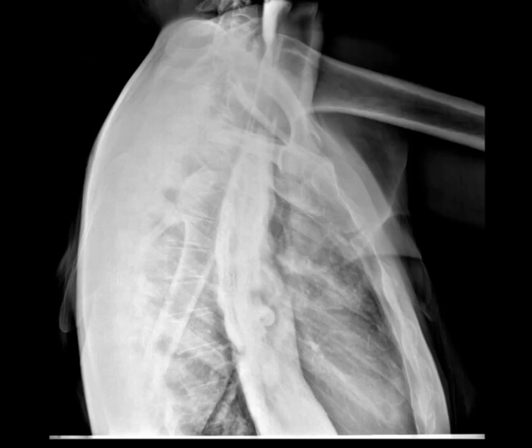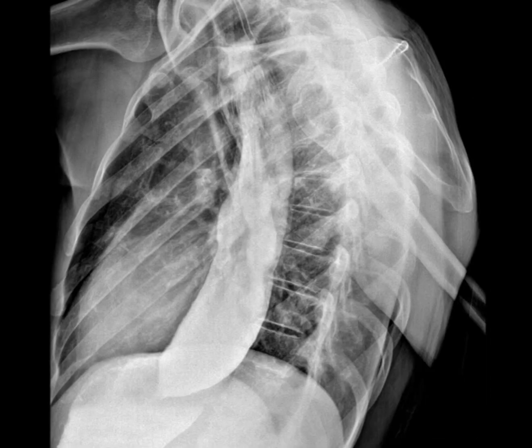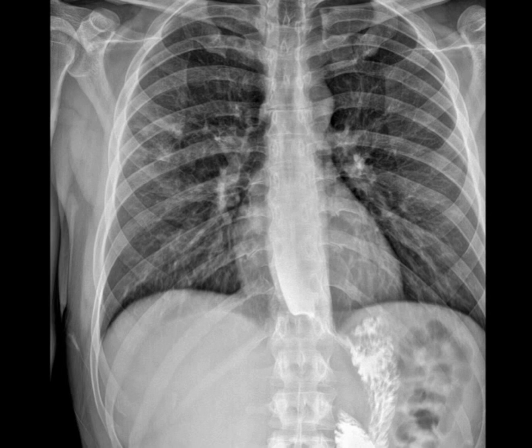It's obvious, it's up. So the obstruction is up. Yeah. And the down is dilated. Yeah. So you have an obstruction up, the down will get dilated. It shouldn't be. Listen, use logic. We are swallowing food. So the end of the dilatation should be the obstructed part. So we need to look for the distal end of the dilatation. Where does it end? Not where does it start. Got it? Use logic.